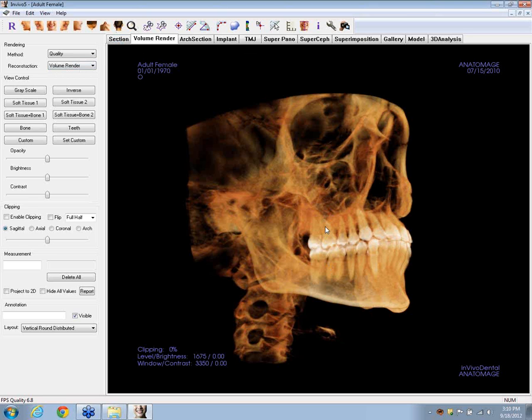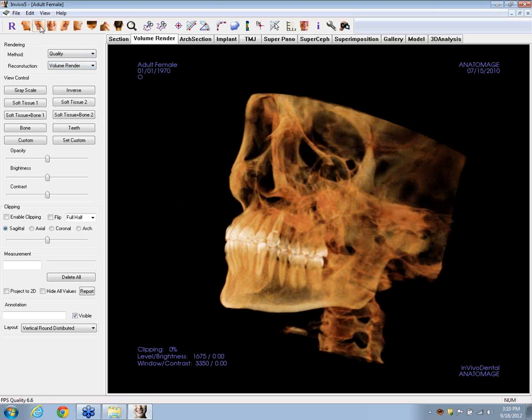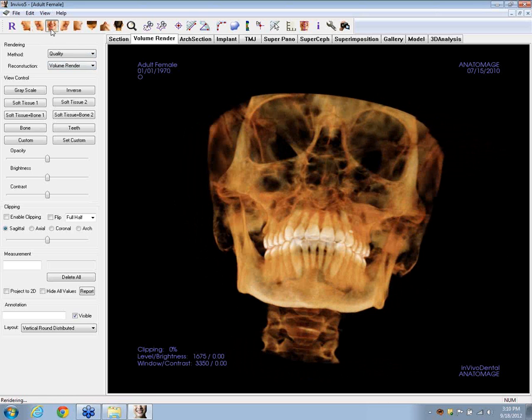So that we can set up a position that you come back to time and time again, a perspective view that you want to recover on a time and time again basis here. And of course we've got our oblique views set from that particular angle.